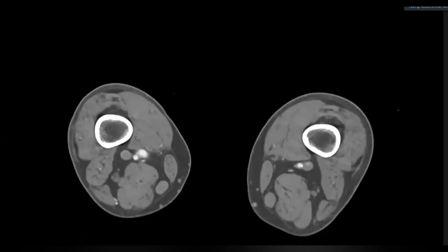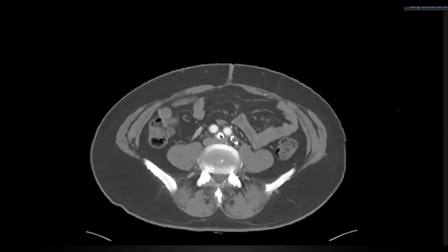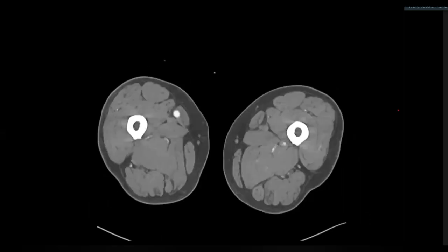So if I go back through this, if you follow the aorta up and down and you see it divided into these heavily calcified occluded vessels, then these tubes, right, this is something that man has implanted. So this is surgery. So this is an aortobifemoral bypass graft. And similar story, if you see something that does not fit any kind of human anatomy, this is another bypass graft, a femoral-popliteal bypass graft. But for the purposes of the exam, if you said this is a vascular bypass graft, that would be enough.